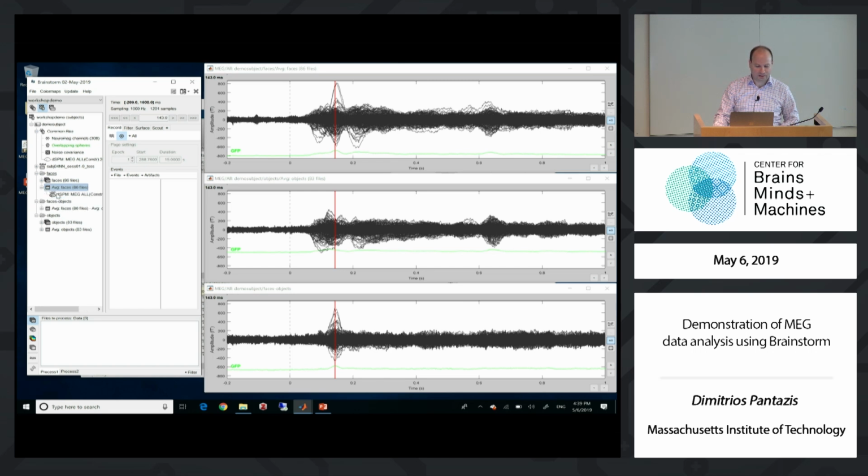Notice, by the way, that I have all these links here, which is the cortical sources, and it's a link because the actual matrix is stored here in a common area, but then it's referred here to be applied to every data trial to construct the source maps. And this is data efficient because sources are 15,000, sensors are 306 only, so it is better to save sensors other than sources whenever possible.